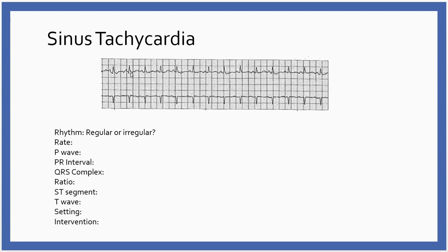That's just artifact. Remember, people move and breathe and things like that, so ignore that. This is a P wave right here. P wave, okay. P wave, P wave. So I have P waves, and it appears that I have a P wave in front of every QRS, so I'm pretty happy with that. And they all look about the same. Now, where it's kind of wonky, squishy looking over here, that's your artifact. That's your patient moving. It's not that there's a problem with the P waves.